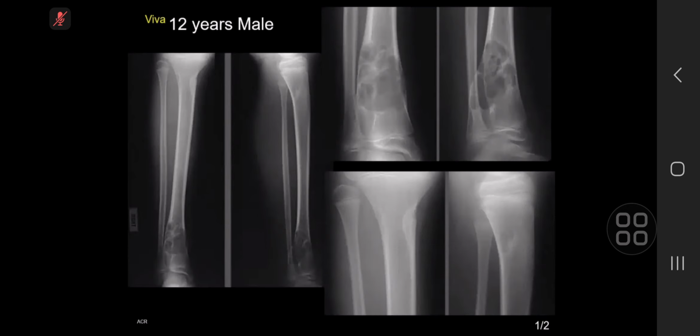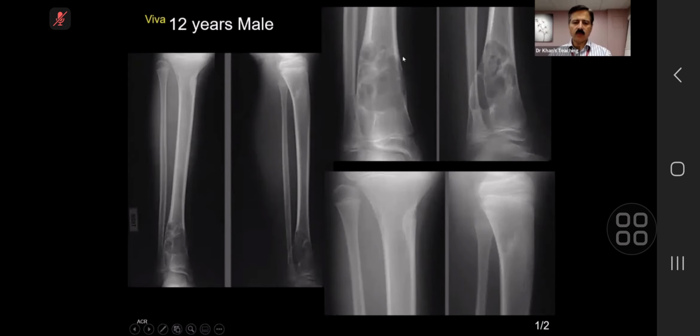Okay, so I've got frontal and lateral radiographs of the tibia and fibula in a skeletally immature male. Can I guide you because of time factor? This is a poor quality film, so these are better for you. Just describe this. This is a close-up of the same thing. And okay. This is a close-up of something which is here.